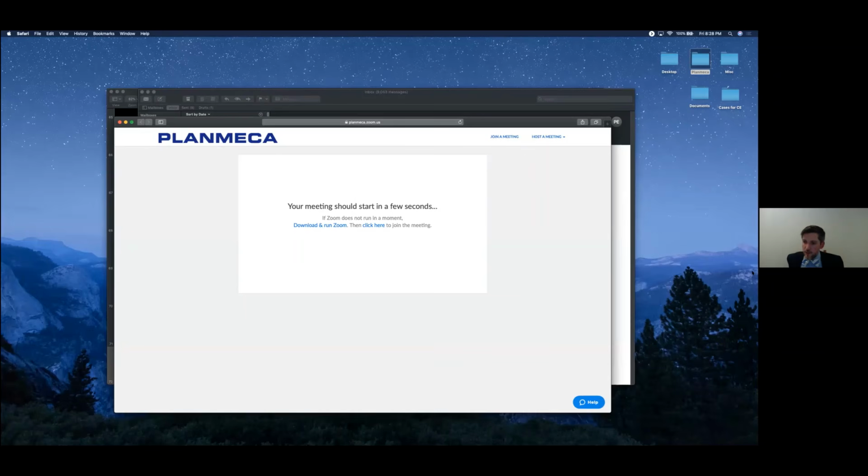Is it possible to define what you want to see in the CBCT? If it is, isn't it better to have a total view instead of a particular tooth? I would say, especially if you were to take a low dose scan of a new patient evaluation, you would want to evaluate the entire maxillary and mandibular dentition.